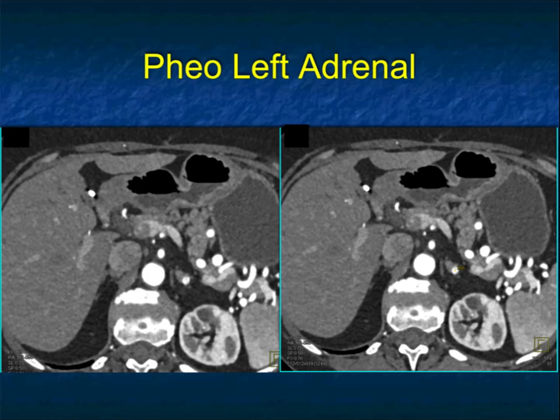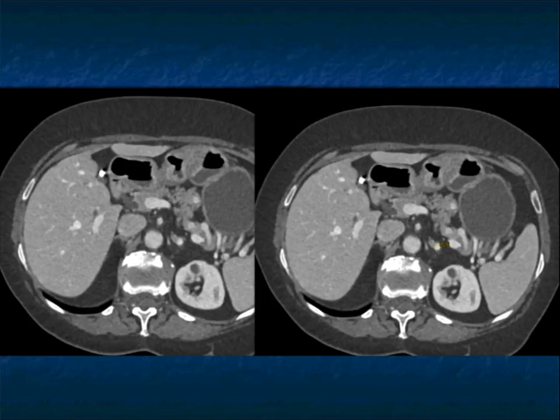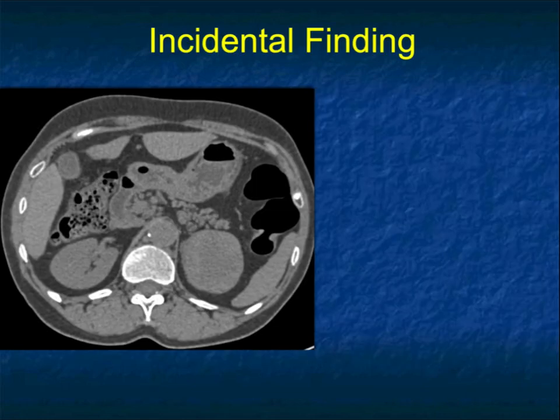And you can see in this patient, very similar to the case before, there's a very vascular lesion measuring over 200 Hounsfield units in the patient's left adrenal. It basically is enhancing almost to the level of the patient's splenic artery. Very nicely shown there on the axial and coronal. And even when it washes out to 120 Hounsfield units from about the high 200, it's still pretty high.